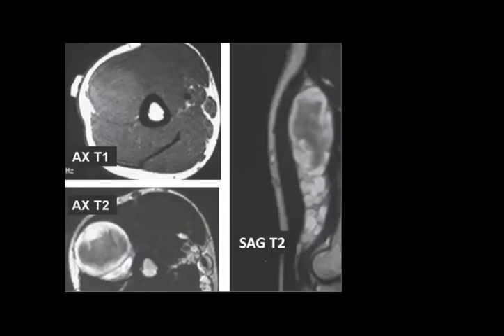Yes, all very nice answers. And you will ask about skin discoloration, what is called cafe au lait patches. And you will think about which nerve it could be. This is along the course of radial nerve. So yeah, neurofibroma, the age is important. The central hypointensity in T2, yes, Sarah, which is the target sign compared to the margin. So this is a characteristic in the MRI.